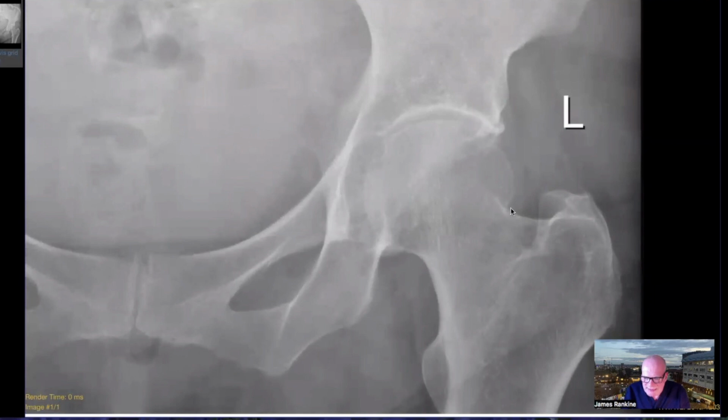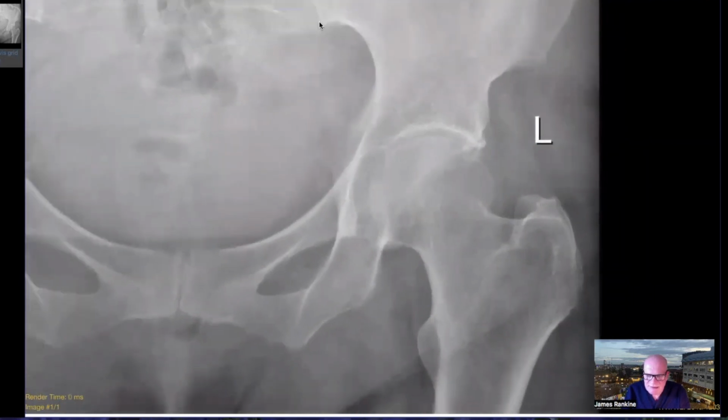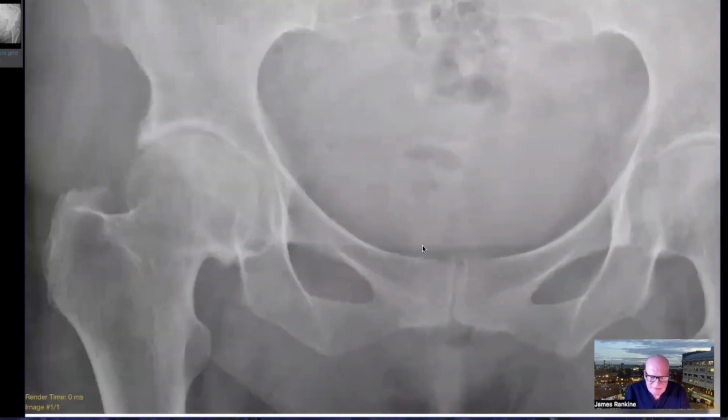I can see a normal trabecular pattern. I don't see any sclerosis. I can't see a fracture here on the left. I don't think the lateral helped. In fact, if anything, on the right, there's sclerosis here. You might suspect perhaps there's a developing fracture through the neck here on the right. The lateral I don't think helps, so I also gave you the CT in this case.